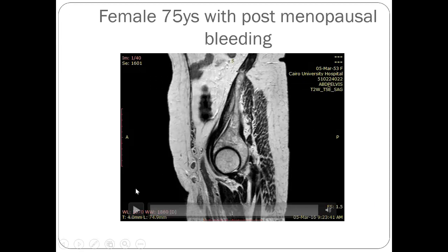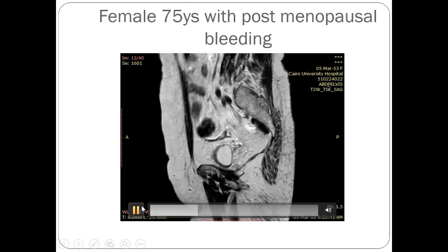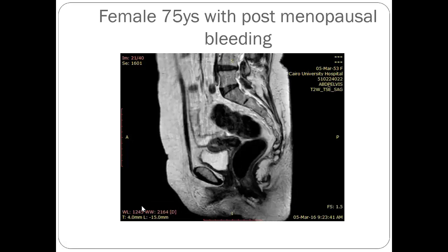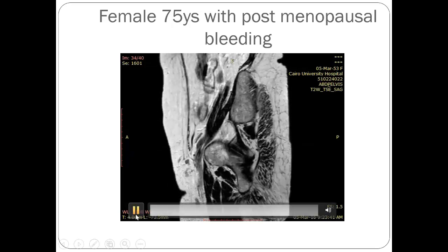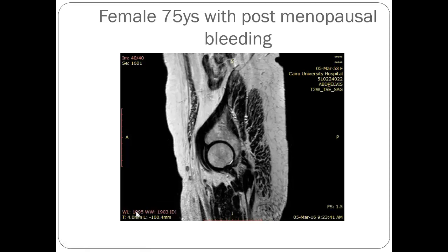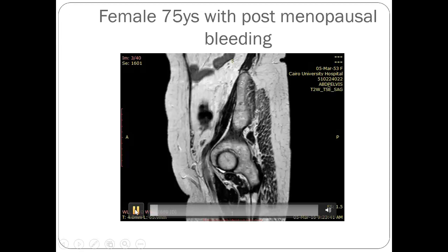A female patient, 75 years old, coming with postmenopausal bleeding. Again, did you pick the finding?